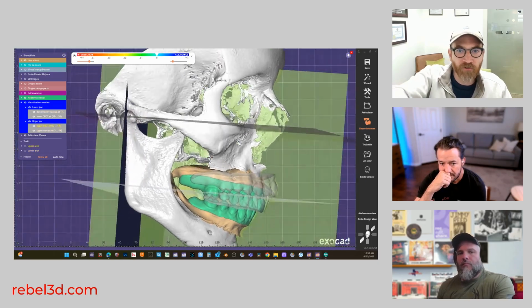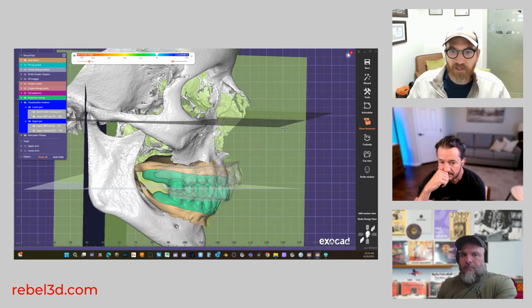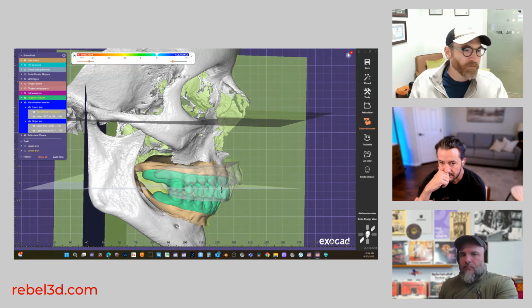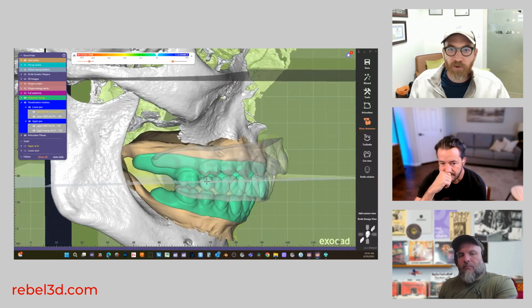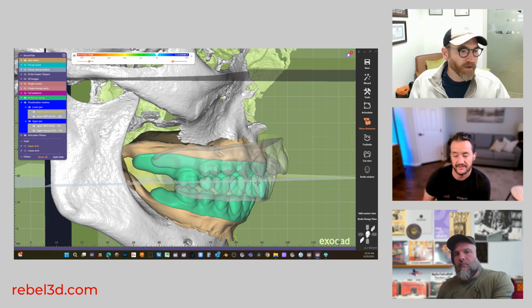So the further you go from the center of a circle along this arc, the more the movement, right? And we know this because of the pin rule. If you open the articulator 3 millimeters at the pin, it's what was it, 1 millimeter at the molars. And so we open this patient up just slightly more at the white. When we put this back into the patient, it's going to be heavier in the back. So they're going to have a slight anterior open bite.